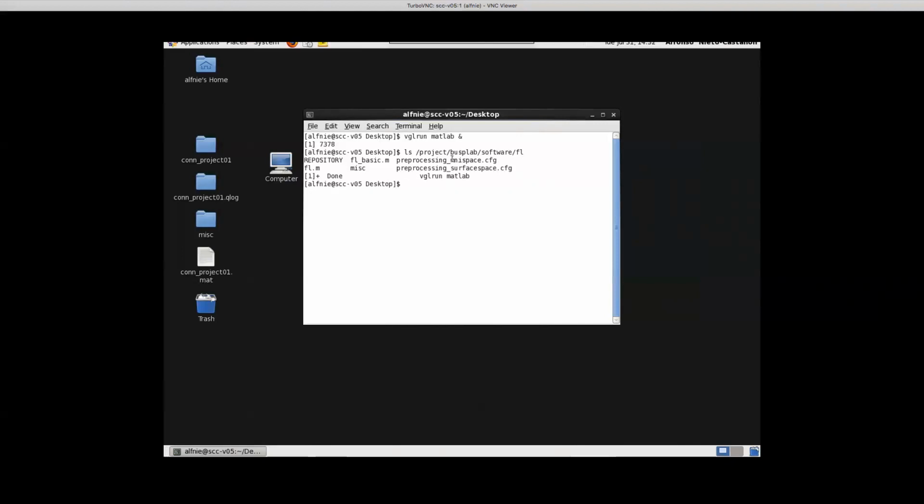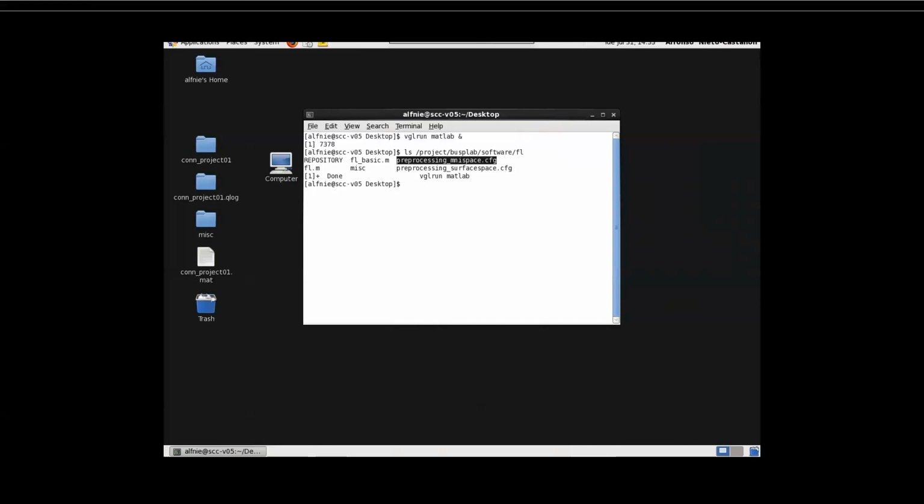Okay. Let me know what names you think make the most sense, just to keep it relatively simple. To differentiate between the 2 versions, should I use something like MNI direct, indirect? You could do MNI direct, and then people just need to know that MNI means volume, or that not surface means volume. MNI direct, MNI indirect.